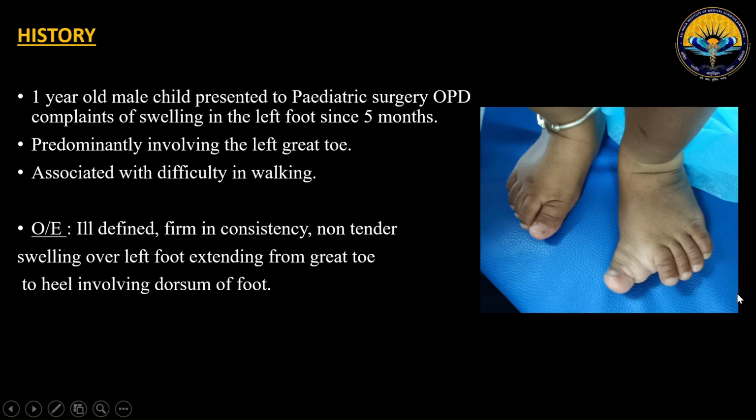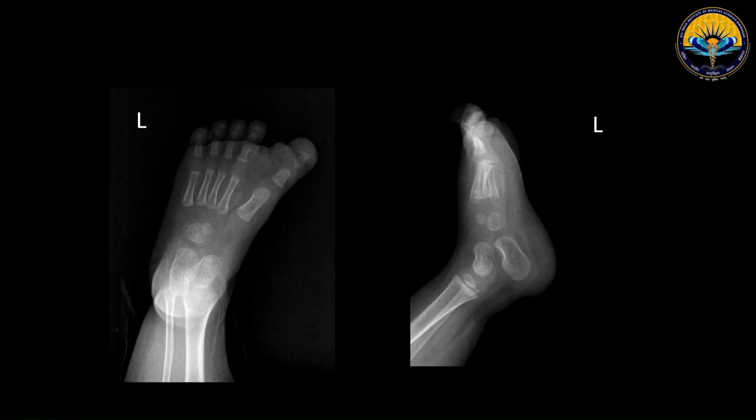On examination, this was a rather ill-defined swelling, firm in consistency and non-tender, and was seen extending from the left great toe to the heel, involving the dorsum of the foot. Then this patient was referred to our department for AP and lateral radiographs of the left foot.